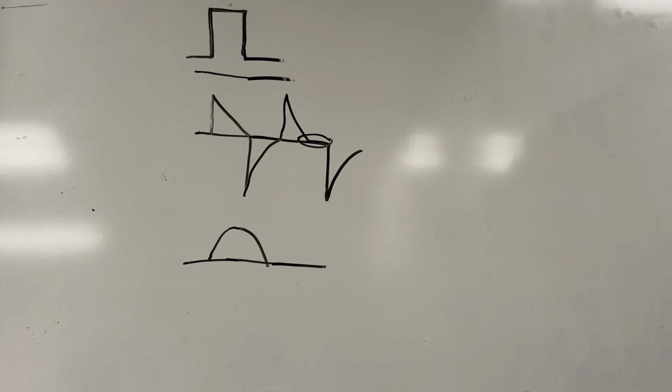So whether your I-time is set too long like that, or your inspiratory cycle off or your end inspiration percentage is set too low, then our inspiratory phase is too long, and it's long enough that our patient is starting to breathe back against the vent. And when they breathe back against the vent, anything that they add to the circuit is just added on to the pressure that's in the circuit already.